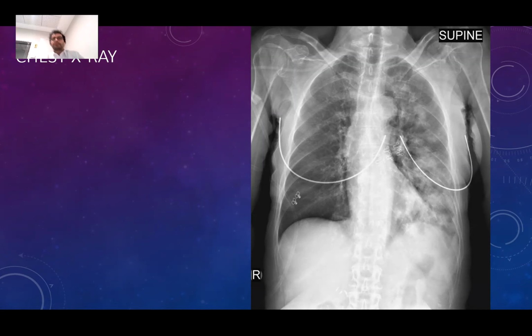Let's skip the technical part for this one. And it's on the lung, right? Let's go. I will try to describe the thing I'm seeing on the lung. How do you describe the findings on the lung here? Can anybody have a word?